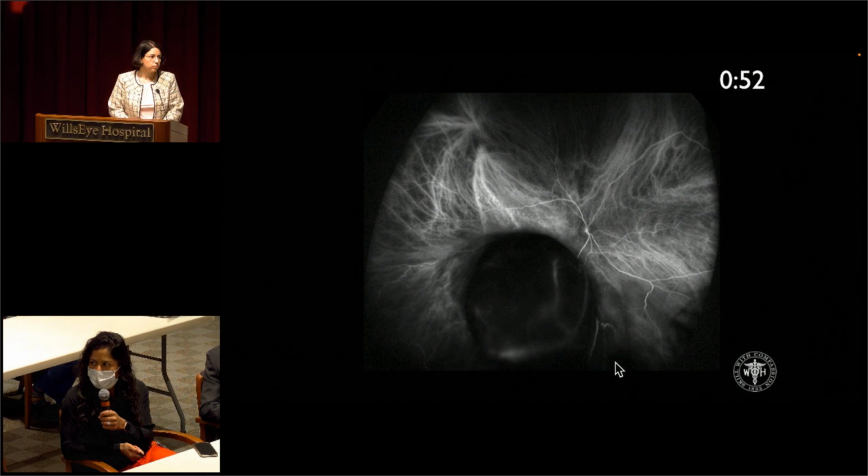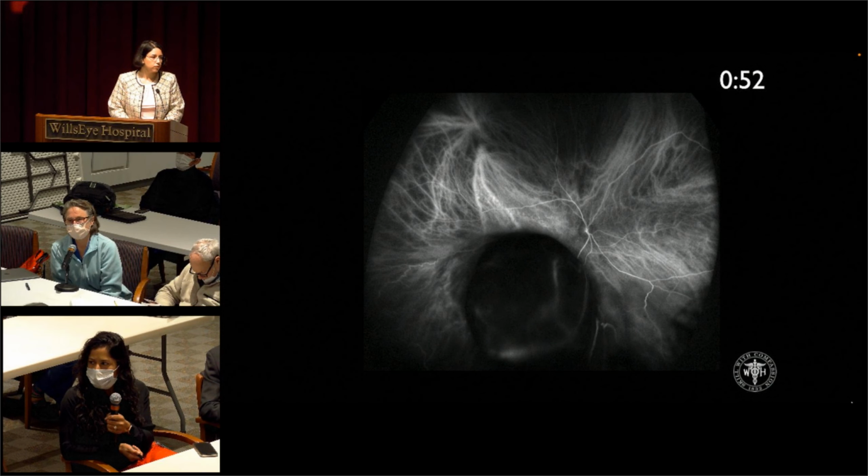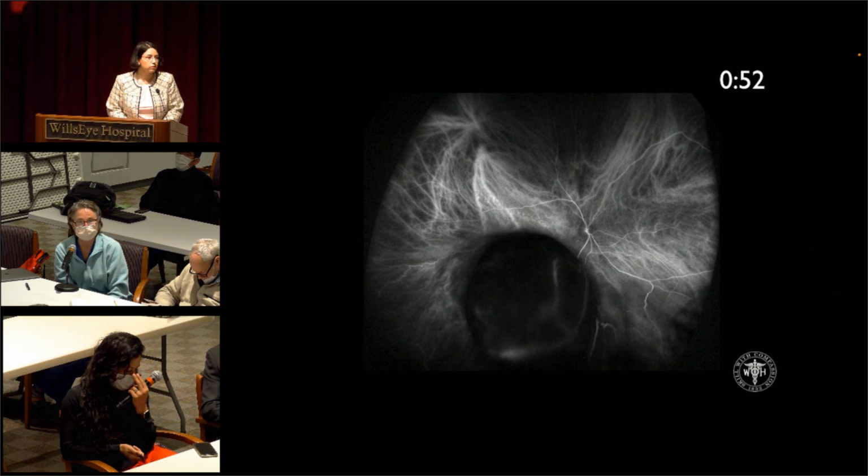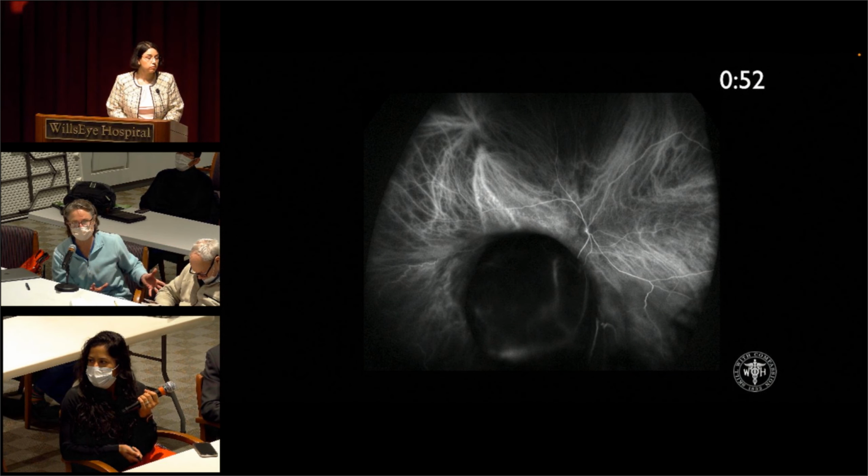Not all that helpful, but we would expect to see a little bit of what we call double circulation, intrinsic vascularity within the mass. But sometimes when it's elevated, it's so out of focus, you're not getting a good image of it. I think the best team in the world for doing ICG of choroidal melanomas is at Jules-Gonin, Zografos and Schalenbourg. They have beautiful wide-angle images showing at multiple layers the internal vascularity within melanoma. Here, if you're just focusing on the retina, this may be so out of focus, it's not picking up in the image.